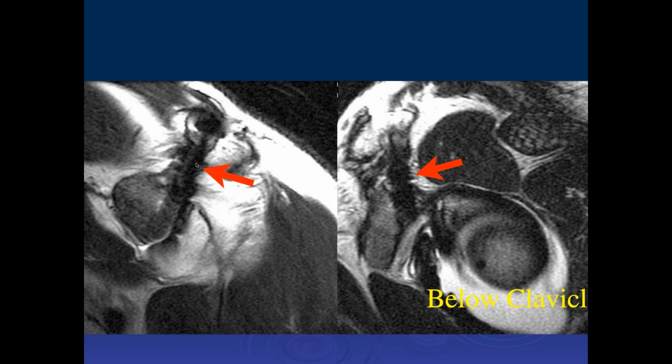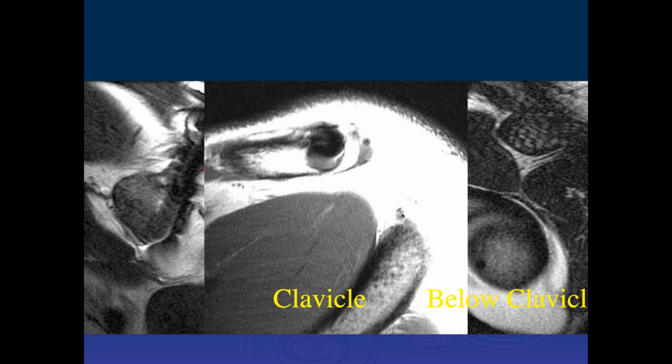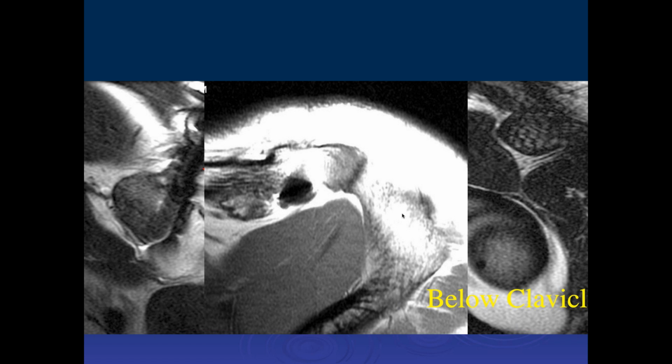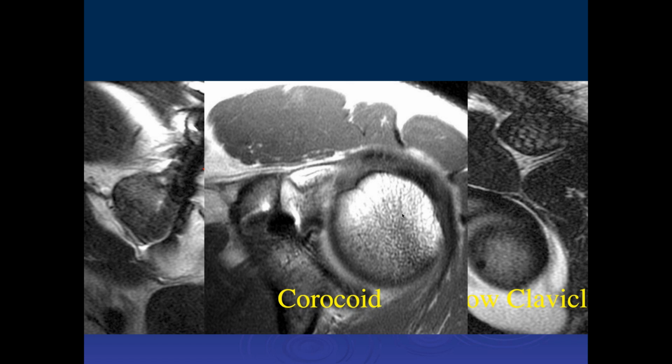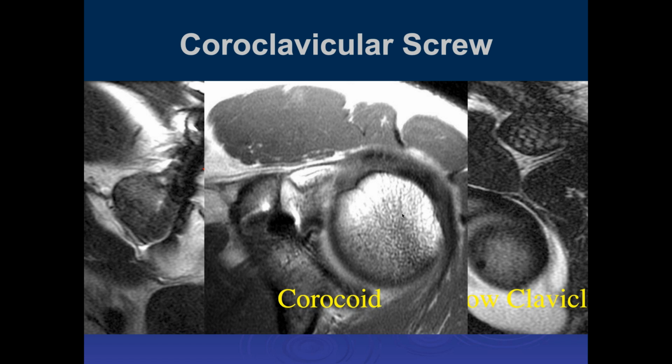And this is one technique that I haven't seen very often, which is basically, that's a Bosworth screw. My favorite screw for doing a Bristow procedure for dislocated shoulders. I don't like to use this Bosworth screw in this condition. I like to use sutures. And you don't have to take sutures out. This you have to remove in 6 weeks.